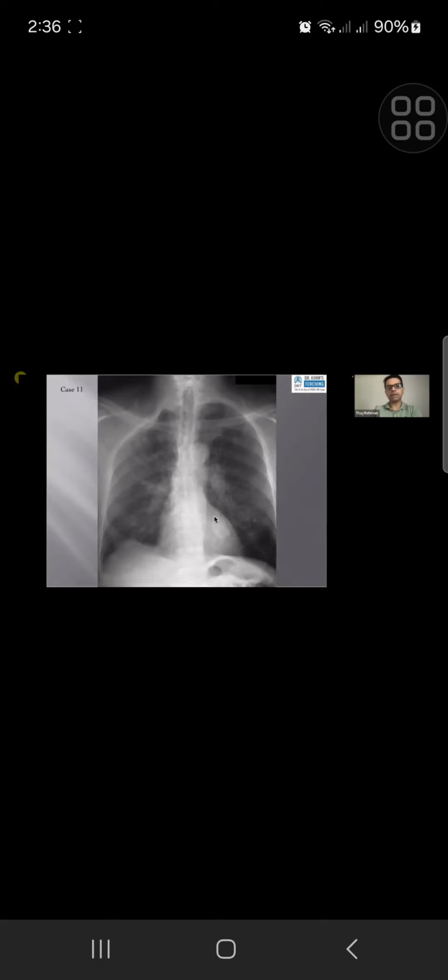So that's good. Well picked up. Yeah. So these are the review areas. Now the lung, think of the lung behind the heart. Think of the lung behind the dome of diaphragm. So there's lung behind dome of diaphragm, there's lung behind heart, and lesions can arise within that lung, and that's difficult to be picked up.